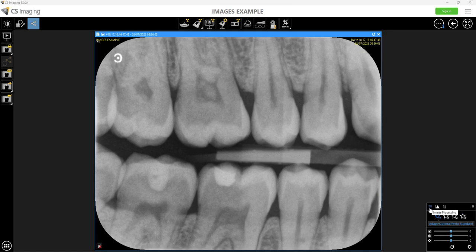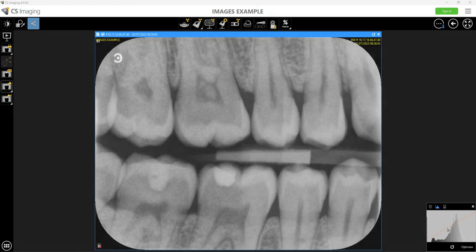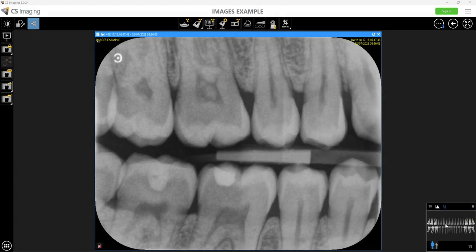So that's the image processing bar. We go along to the histogram equalization button. We can move this bar around, and again that adjusts our brightness and contrast depending on how we want to look at it. And finally, our dental arch. Any teeth that are assigned when saved will be applied on here, and so we can highlight the area that we're looking at on those teeth.